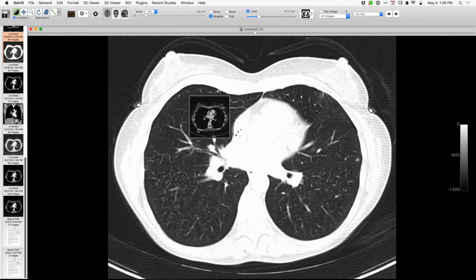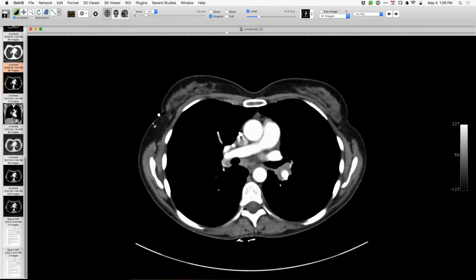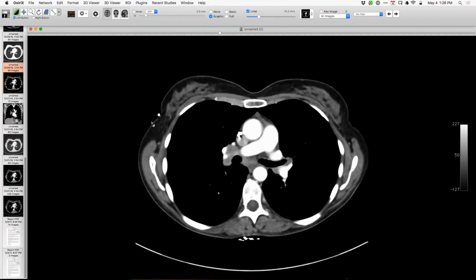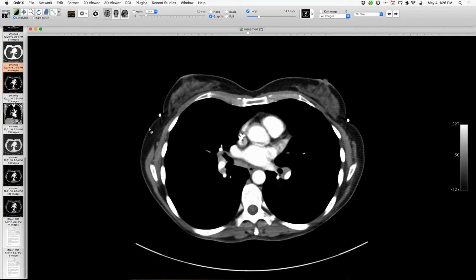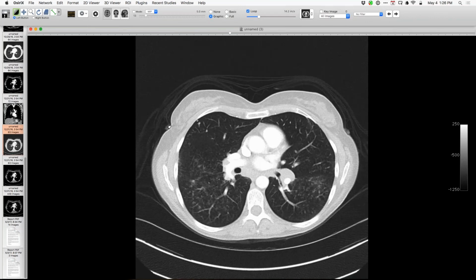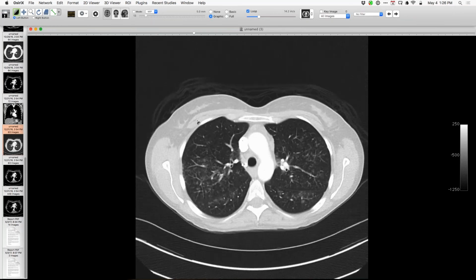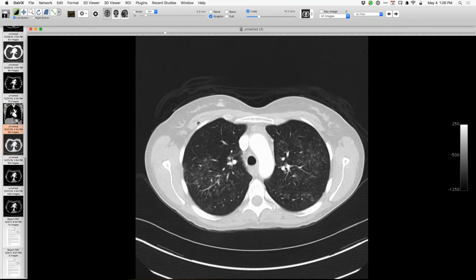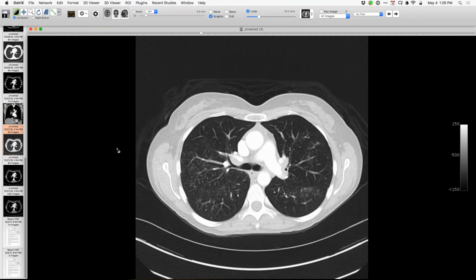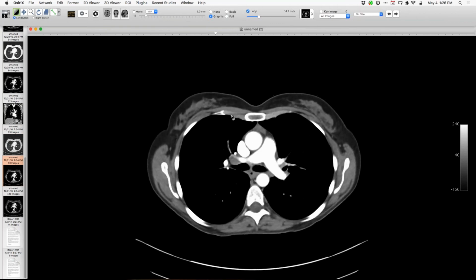I'll also show you that in October, let's have a look at these lymph nodes. They're a little bit big, and that's a new finding. So the hilar, suprahilar, infrahilar, intrapulmonary lymph nodes are a little bit big. Now I'll go back further, to December, and you'll see that the lung disease is still present. It's a little bit more extensive. Here, in addition to small nodules, there are almost some ground glass opacities admixed with the more discrete nodules, but clearly a progressive pulmonary parenchymal disease. And again, to show you the extent of the lymph node enlargement here in December.